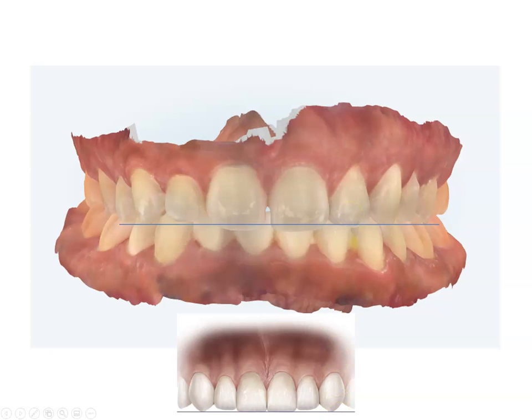And this is how it should look, where if we draw a line, ideally her left side looks better than her right side, but this front tooth needs to be shifted up to match up with the sharp tooth, these two, the central and the canine, and the lateral, the side tooth, is in a good position. And on the other side, this tooth needs to be shifted in a hair also, as it's beyond the line, and we need to make sure that the lateral is pushed up a little bit and the canine. Now ideally this is the ideal position. Obviously with Sandra's, it may not work 100%, but if we could get her to 90%, that'd be great.